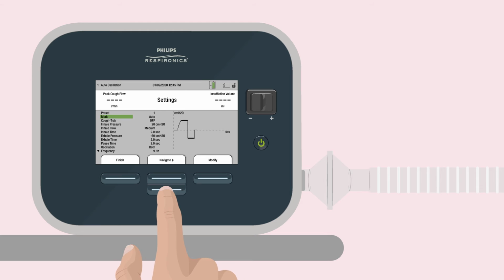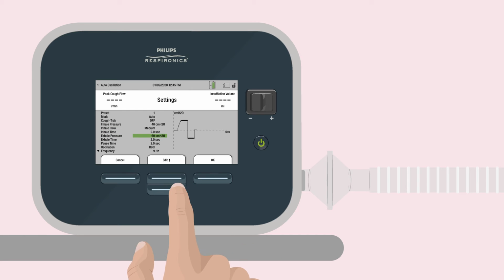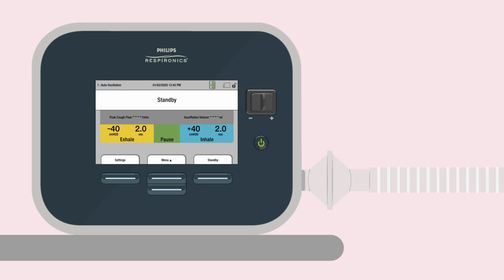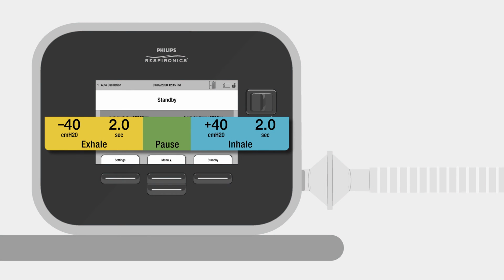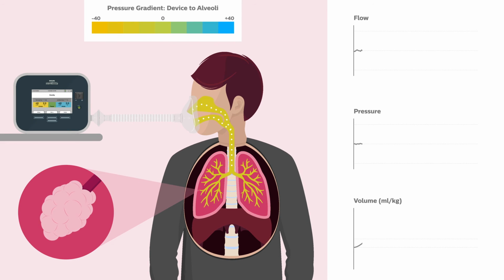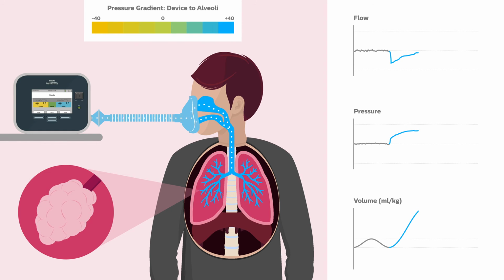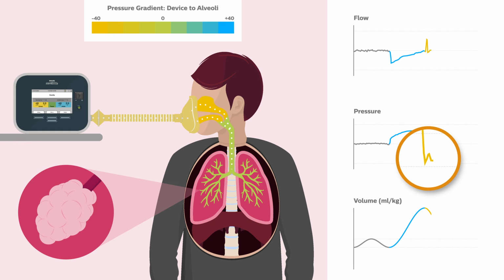In model 3, we're going to examine the zero pressure point and upper airway stability, this time using balanced pressure settings and in a bulbar ALS patient profile. With our third model, although our MIE pressures are balanced, a variety of new factors alter the zero pressure point, namely the loss of the ability for this patient to close their glottis and to create active compression result in a significant decrease in lung recoil pressure during the exsufflation phase.